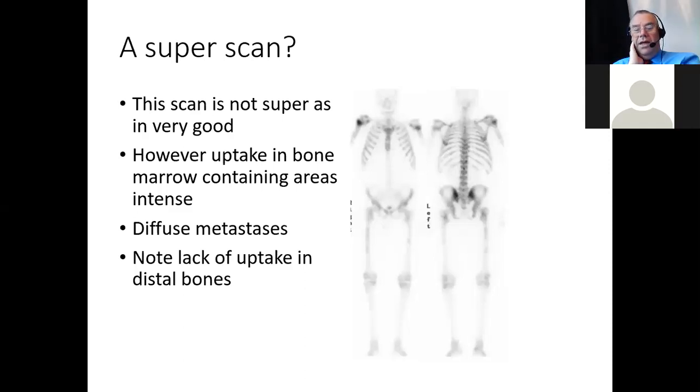Most commonly, it occurs in prostate cancer. And what you can see is this diffuse uptake in the spine, the ribs, the pelvis. And you can even see the red marrow distribution here in the humerus because the uptake disappears. You can't see the distal humerus. There must be some concern about this focal uptake in the surgical neck because that could be an incipient fracture. So that would need to be x-rayed.